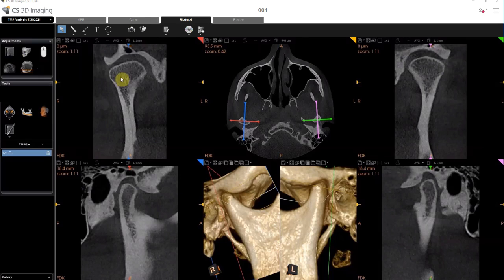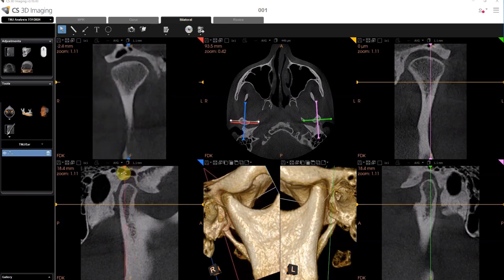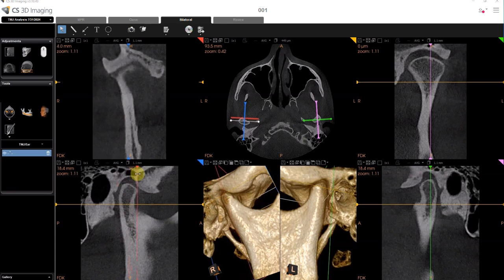To move through the MPR views, there's a couple ways you can do that. To figure out which handlebar you want to grab to move through this view, this one is red, so we're going to look for the red handlebar. Down below, we can move our cursor over the red control, left click and hold, and move across. Notice how quickly you can move through the slices.